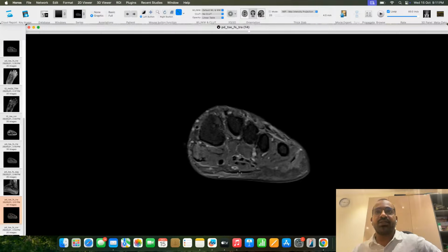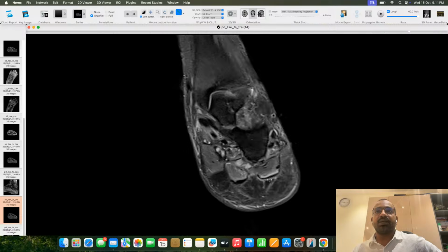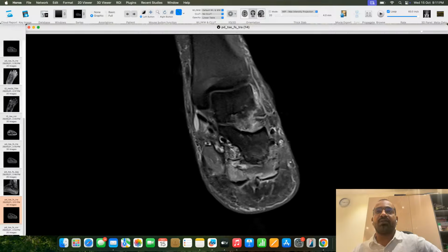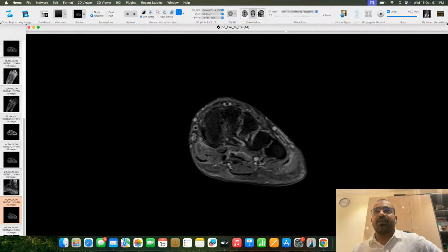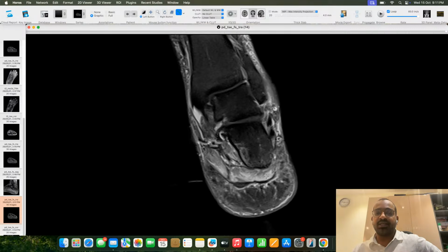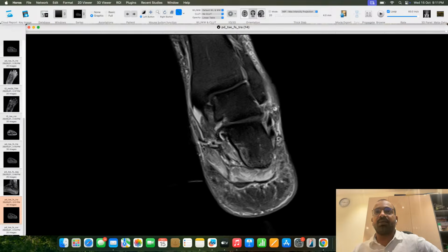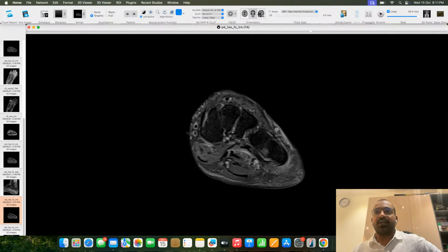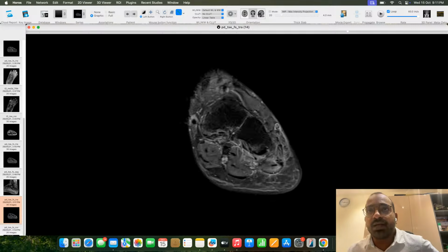You see this plantar fascia? We're going back. Yeah, we see something here. This is also plantar fascia. This entire thing is plantar fascia. As you see, this is going and attaching at the level of base of fifth metatarsal. So this is a lateral band of plantar fascia. Medial, lateral, and intermediate zone. So here we have the entire plantar fascia. If we go, this is the lateral zone or lateral band of the plantar fascia that is also inflamed. So why do we need to know the importance of the lateral band of plantar fascia?